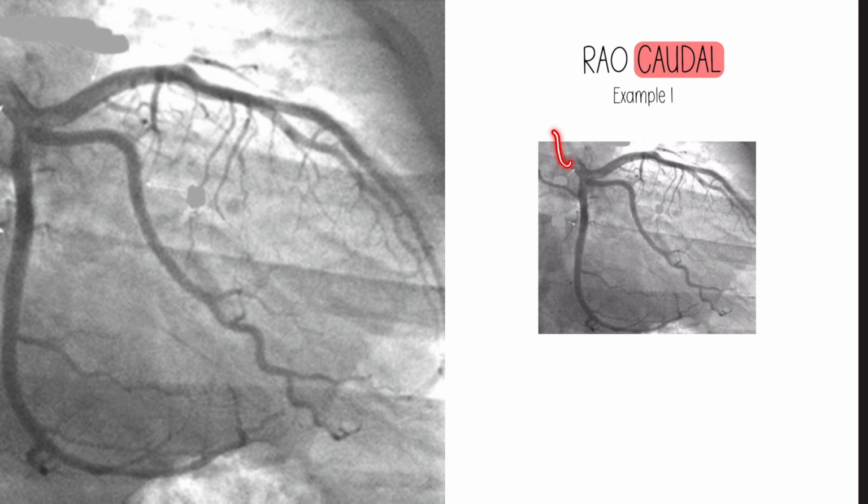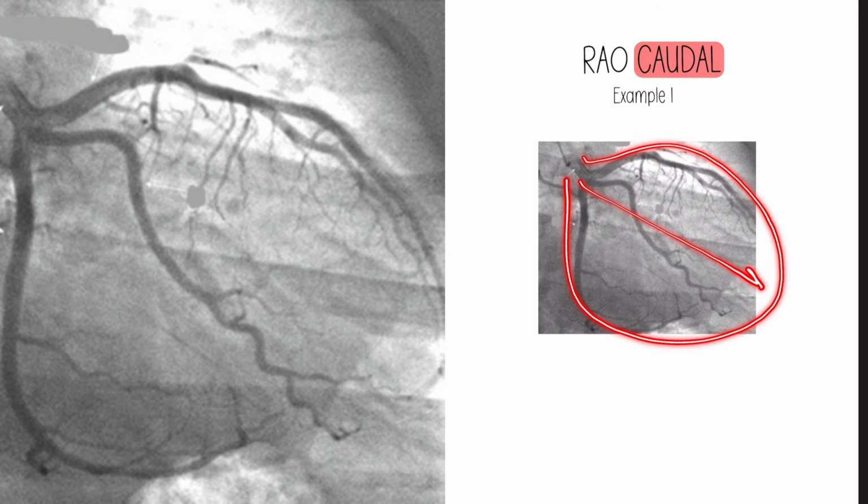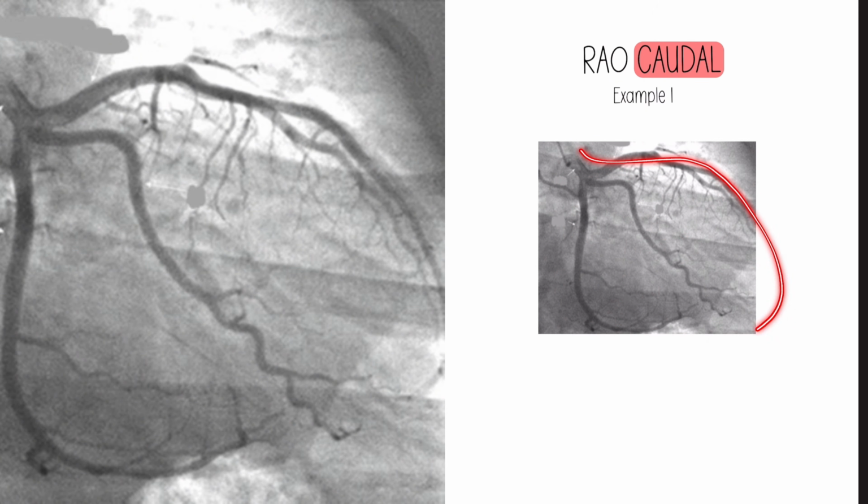Now I know the spine is kind of out of the image, but it is over here, which is why we like a different tactic to be able to trace the outline of the heart. It is apically pointing this way, versus this way is LAO, right? So this is an RAO view, which tells me that this vessel is the circumflex. This is our questionable ramus, and then this is the anterior wall, so the LAD and diag are up there somewhere, overlapped on each other.